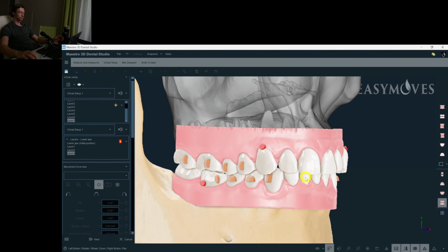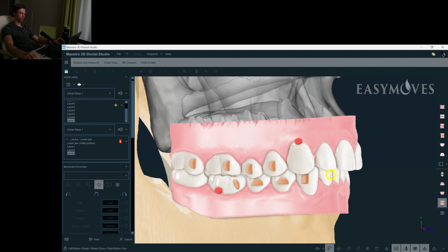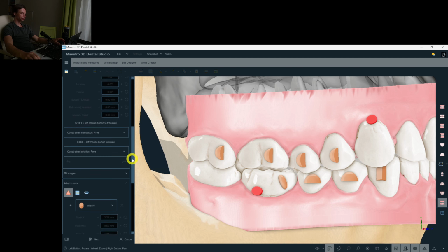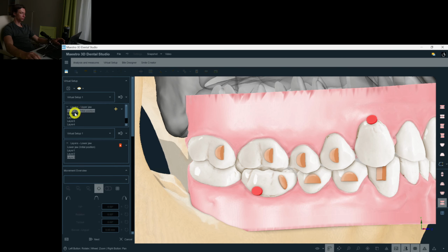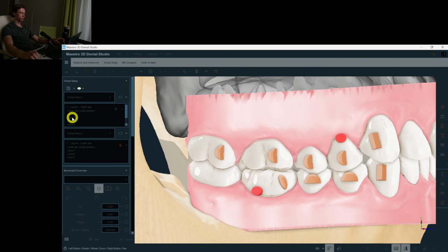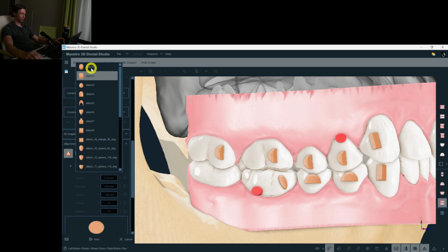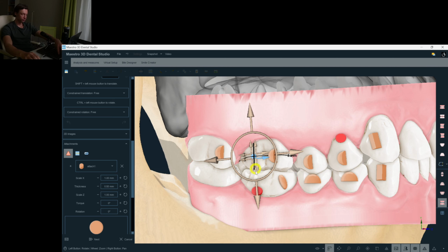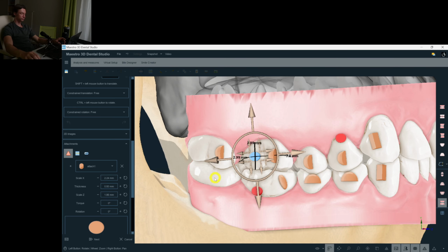What else can we do? To keep the molars after the distalization to prevent relapse of it, we're going to use some other nightwear elastics from here to there.